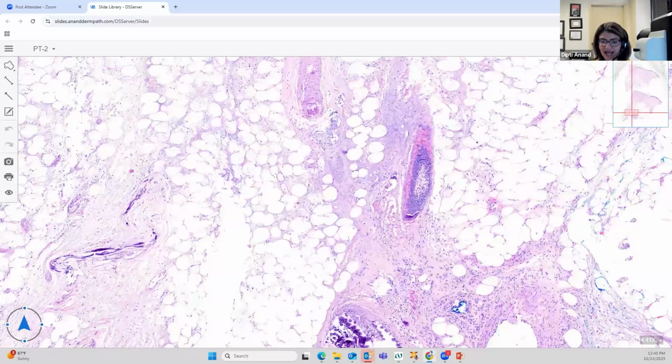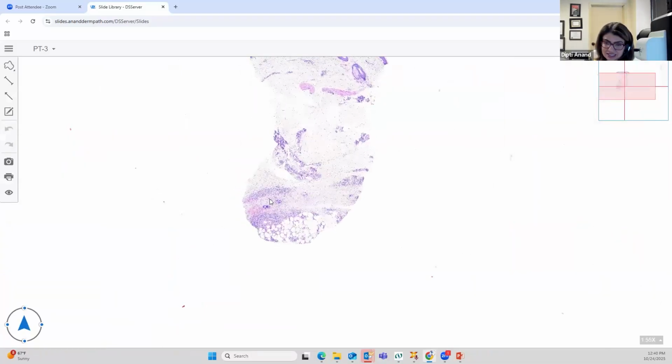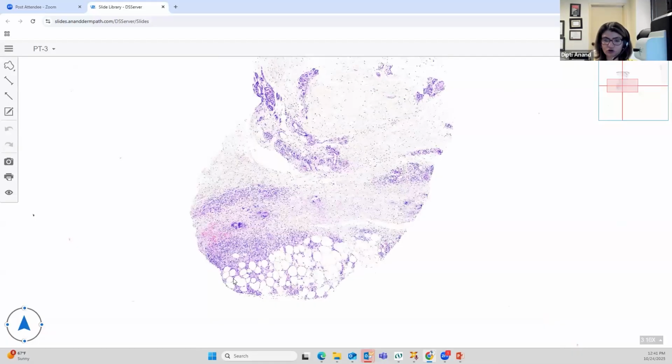Okay, so now let's come back to your septal panniculitis. As I said, by definition, if you're seeing the septum, that's a septal panniculitis. In a normal lobule, you do not see the septum. So if you see the septum, it's septal panniculitis. If there is lobular panniculitis, there is septal involvement, but it's much more predominantly lobular, and that is why you do not pick up the septum. But in a septal panniculitis, there is predominant involvement of the septum with minimal periseptal lobular inflammation. So it's not that the lobule is not involved. There is a little bit of spillover of inflammation into the adjacent lobule, but it's predominantly septum.